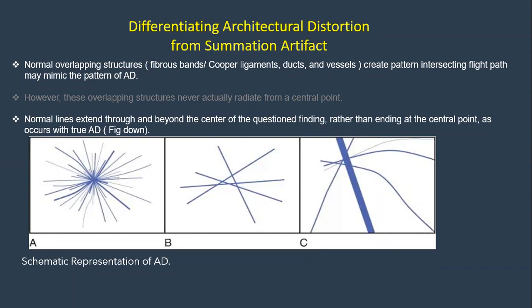If somebody asks you or asks me why this is architectural distortion, why not summation artifact, I have to explain for him based on these criteria.